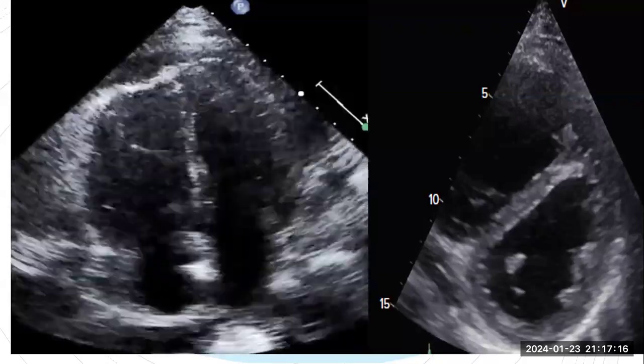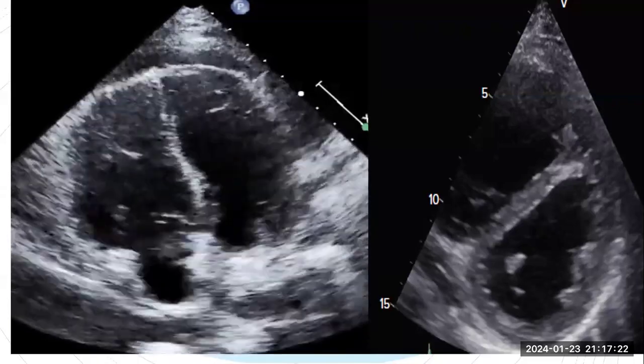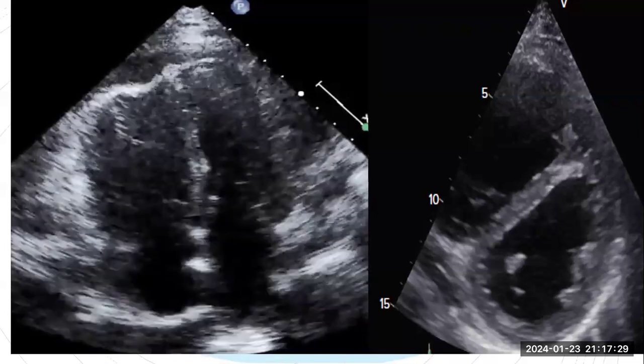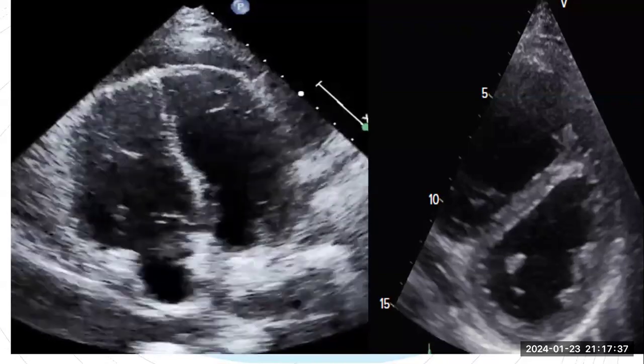It's just a one view. Give me all the findings. Yes, Doctor. Diagnosis. Please go ahead. Okay, the RV is dilated. There is reduced function of the RV.